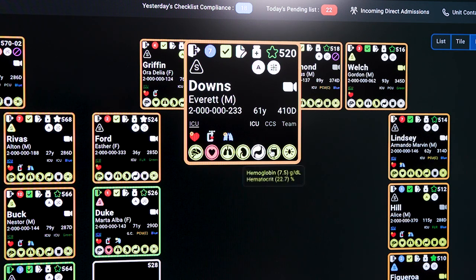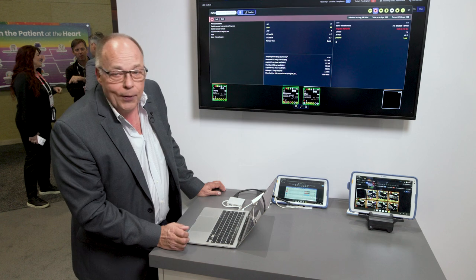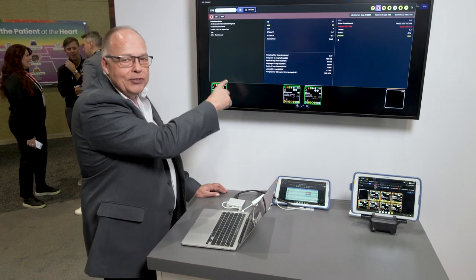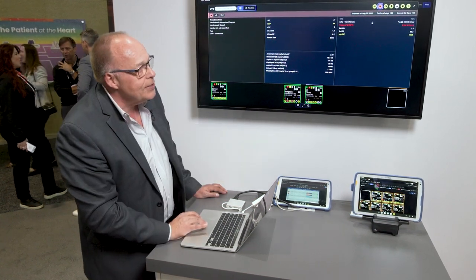And by hovering over each of these organ systems, it'll show you which data points should maybe have attention. If you click on that organ system, it gives you a specific view of what's happening within that organ system. All the current information is displayed here, including historical information, current vital signs, medications, and lab results.